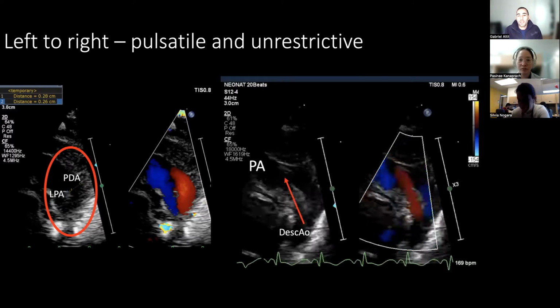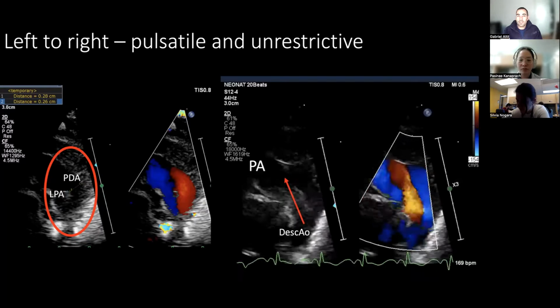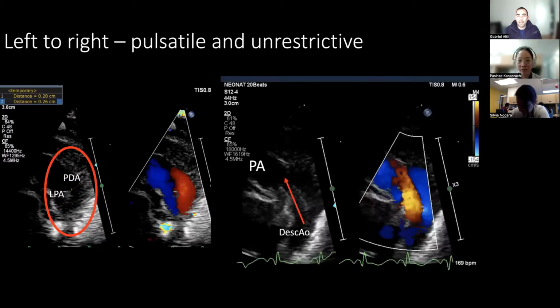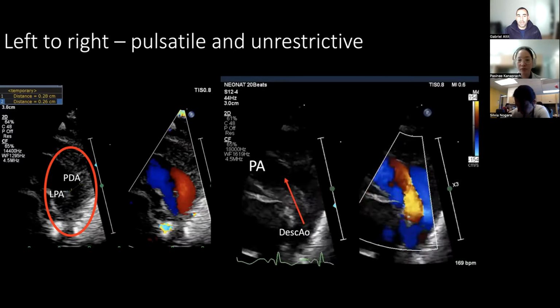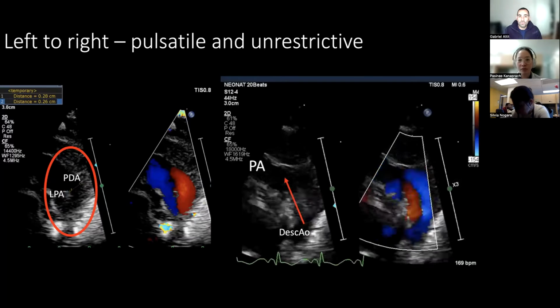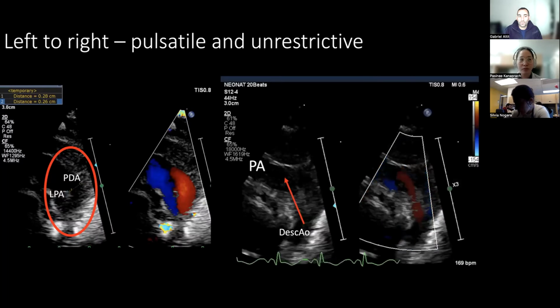We probably know that when you're subjecting the lungs to excessive flow, the PVR will slightly increase, but as a reaction to the increased flow. So it's normal to have higher PVRs to dampen the flow, but it's not a fixed increase, like in pulmonary vascular disease where they have much more smooth muscle in the wall of these vessels. It's really reactional to the increased pressure and flow transmission.